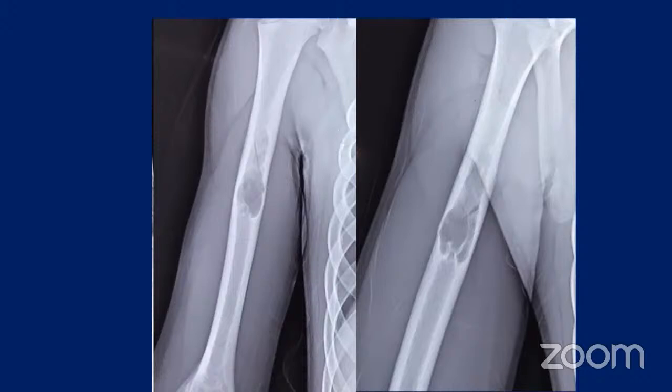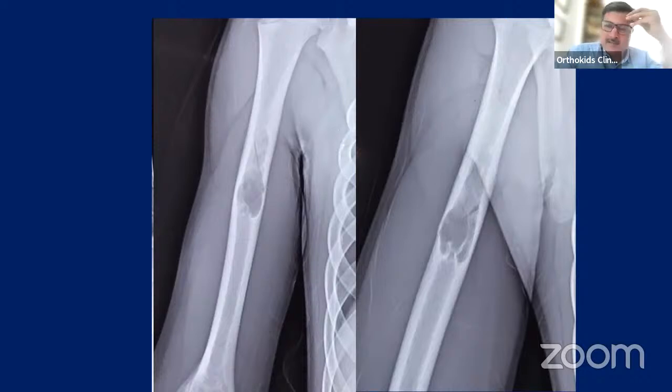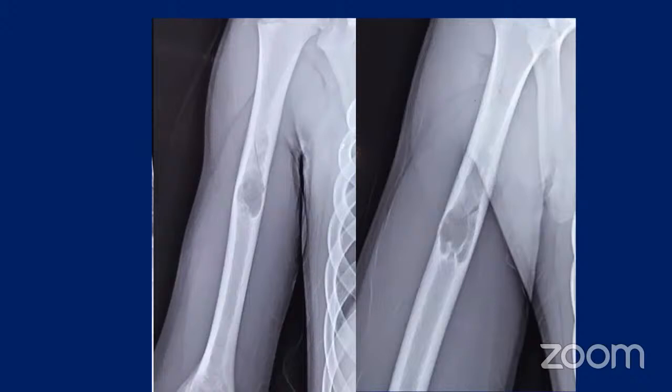So, Mandip, are you still driving or are you with us? No, I am here. Can you tell us, as a clinician, when you see such a pathological fracture through a lesion in the diaphysis or mid-shaft of a child, what differentials you would think? Of course, as the other panelists said, EG is one of the differentials. But this is too well demarcated for me to think it is an EG. We have seen EGs to be an intermediate thing between benign and malignant, where the zone of transition sometimes is not this sharp, and many times we have seen more destruction as compared to this particular lesion.